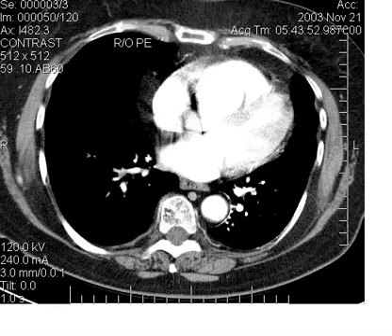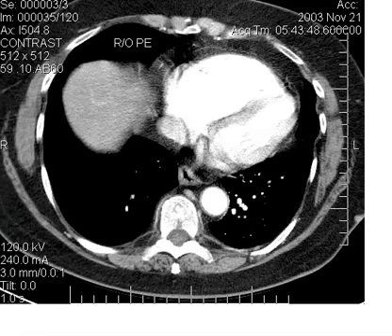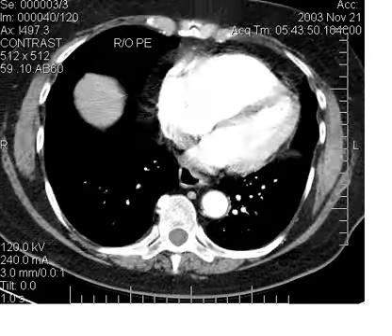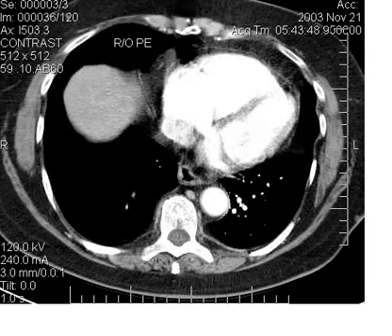And that's about all there is to it. The only other issue is looking out if we don't see them in those locations, looking out for them in these smaller vessels, which can be subtle and just take some time to look at a number of cases and get comfortable for what is and is not positive.